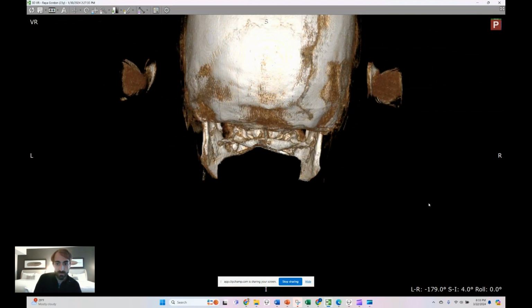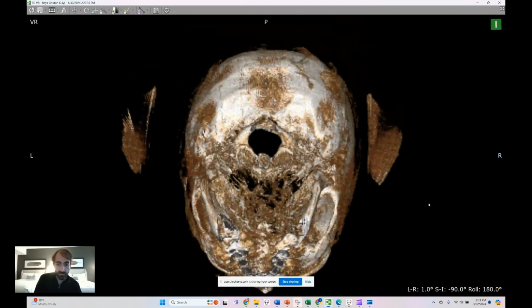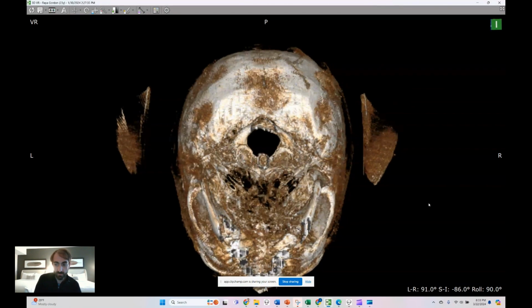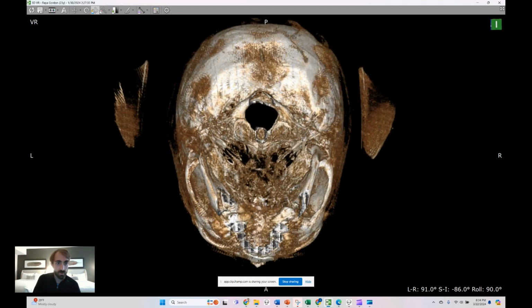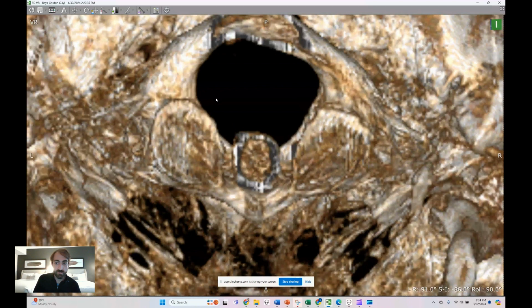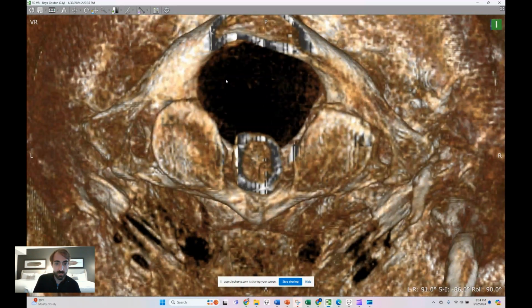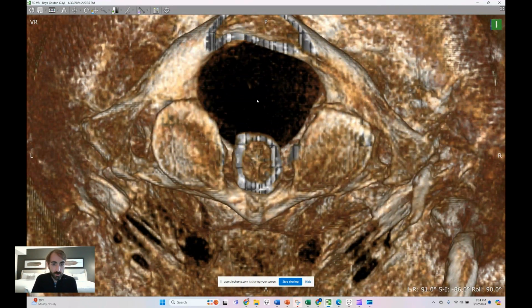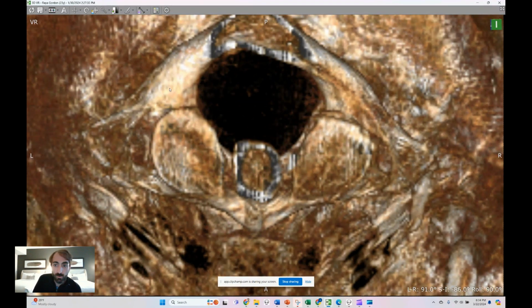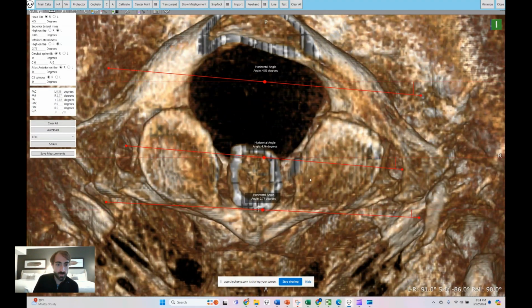Patient's already unrotated, but they did have 4 degrees of head tilt. So taking out head tilt, taking out head rotation. There's her atlas with the shading just right on that. Beautiful. Beautiful, beautiful. Okay. So we open Toolkit to measure, clear all.